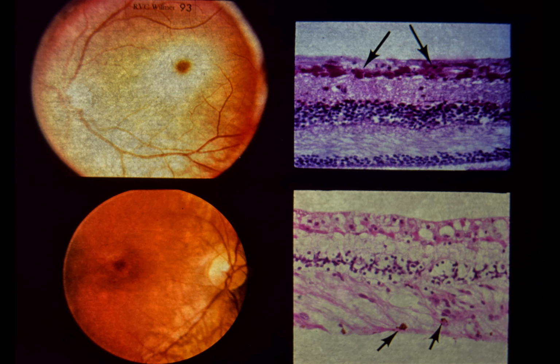Because of the large number of ganglion cells in the macula, this region appears white, and the resultant opacification increases the contrast between the fovea, which is free of ganglion cells and normal in appearance, and the surrounding opacified retina. It is, therefore, not the cherry red spot that is abnormal, but the surrounding retina.